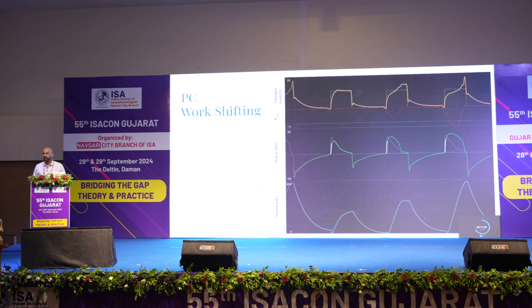So moving on, the next thing is to look at the load and look at work shifting. So work shifting is another way of saying flow starvation, but technically flow starvation does not apply to pressure control. Pressure control means you can get any flow you want. So using the word flow starvation doesn't make sense. Flow starvation applies more to volume control.